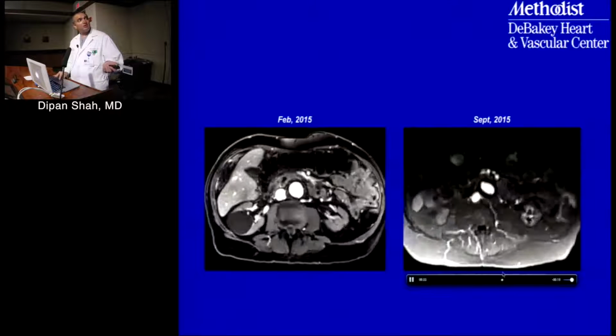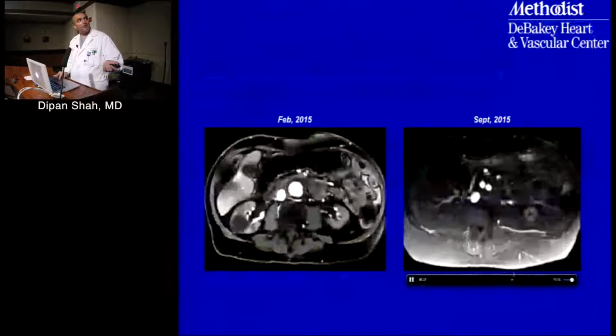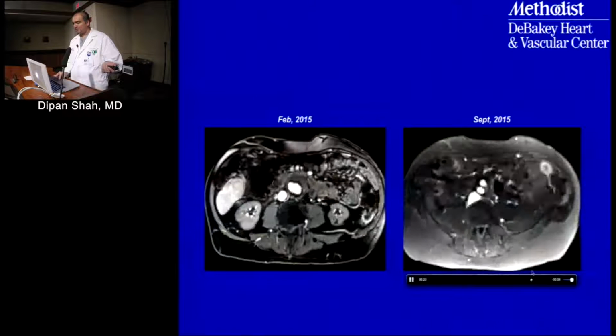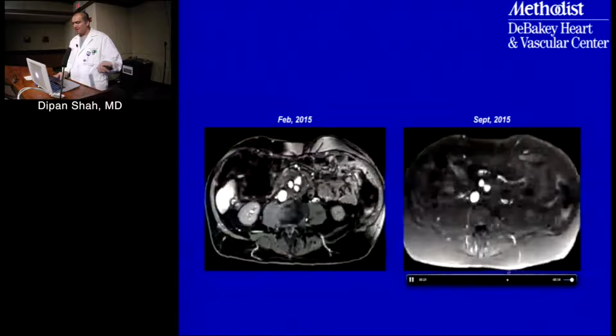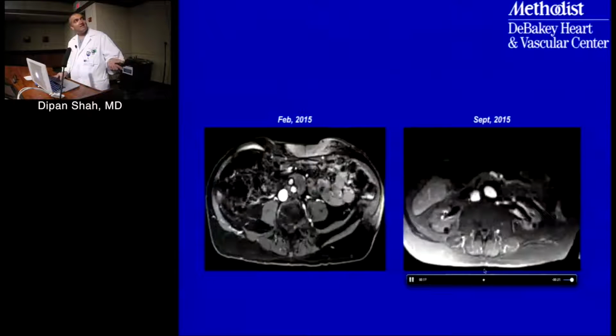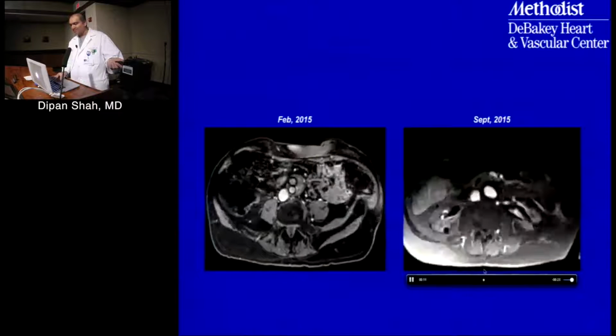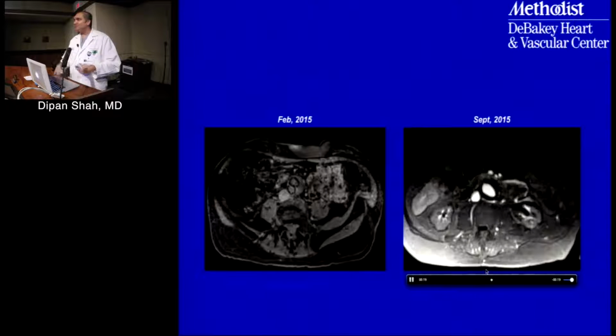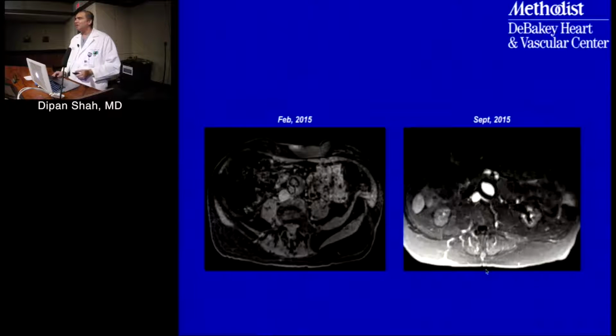It's a little bit dark on the screen here, but in fact, you no longer see that pool of contrast that we saw before. And the size actually also looks smaller. I don't know if you can see it that well because it's dark, but on my screen I can see very nicely that the size is quite a bit smaller than before as well. So this is what we consider a successful result.